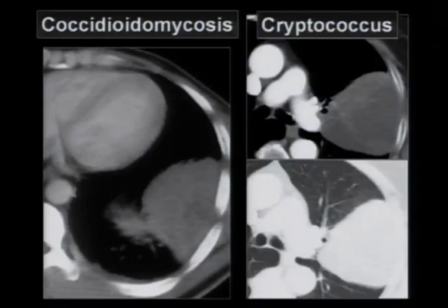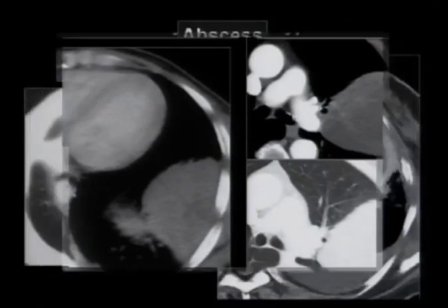In this case, this patient on your left here, the cocci case, was biopsied. They found characteristic features, treated with antifungal, and the lesion goes away. Cryptococcus, more commonly you're going to see in immunocompromised patients, but once in a great while, like this patient, you may see it in an immunocompetent patient. They may be associated with people who are hiking through caves and whatnot, and sometimes it's just somebody who comes off the street and for whatever reason they got crypto. So when you think of fungus, you've got to think about cocci and crypto and the other endemic fungi as potential causes for lung masses.